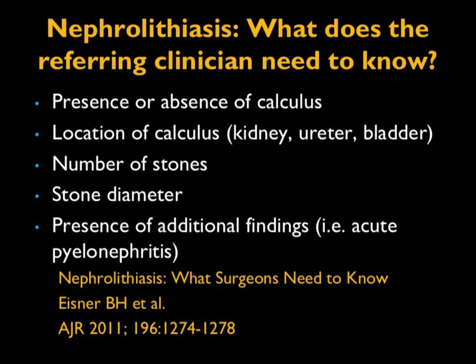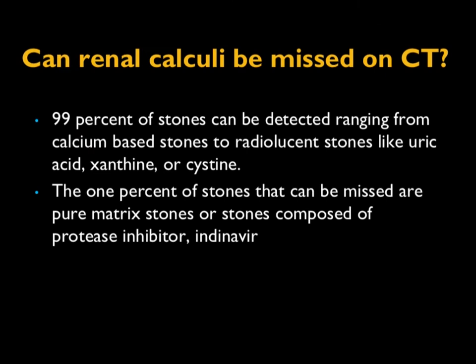We can do that, though often the densities, with higher densities being calcium-based stones, usually works well also. Now, people do ask the question, can stones be missed on CT? Well, the answer is 99% of stones are detected regardless of their makeup.